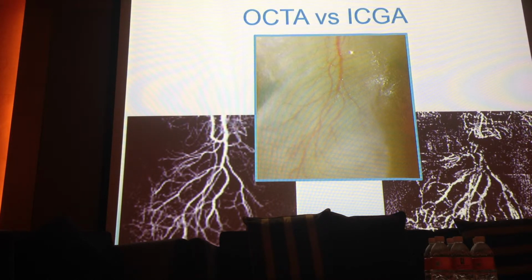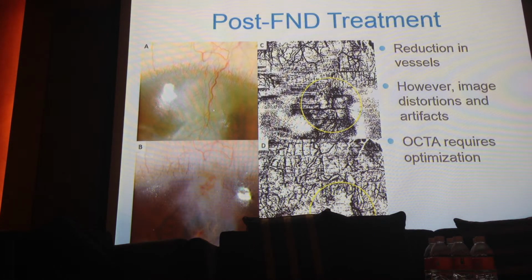But I just wanted to open it up. It looks like nobody has the answer. But we scanned this patient a lot of times, and fortunately he didn't faint from the scan. He fainted from the ICG. So here's the patient. Yeah. So we buzzed this, and this was the post-op day 1. But eventually, it cleared up completely, and you can see the regression of the vessel.